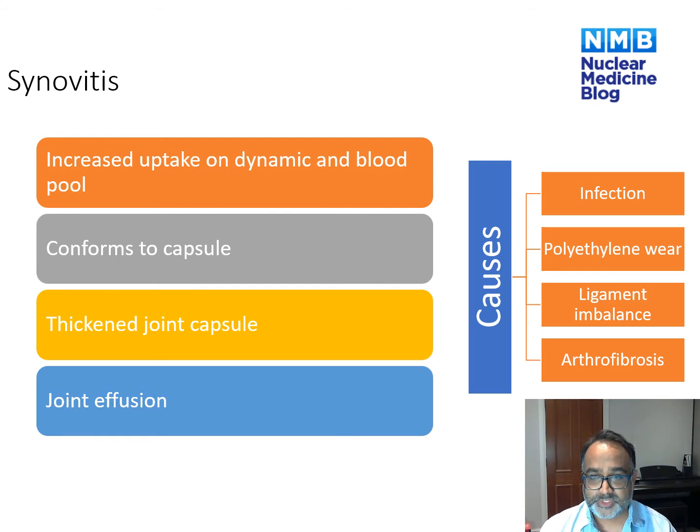There are several causes for synovitis after a knee replacement. Obviously, the most concerning is infection, but we often see it associated with polyethylene wear and ligament imbalance. Finally, you can see arthrofibrosis, which is a chronic inflammatory response within the knee, which can cause a chronic synovitis.